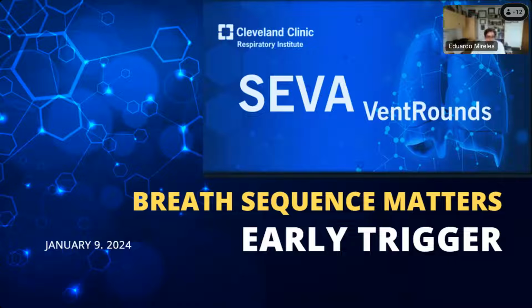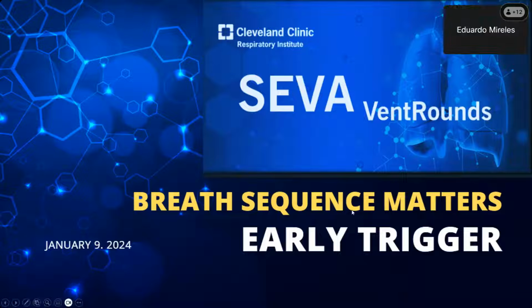These are SEVA VentRounds. And today we're going to be talking about why breath sequence matters when you talk about modes of mechanical ventilation, with this interesting case we had.